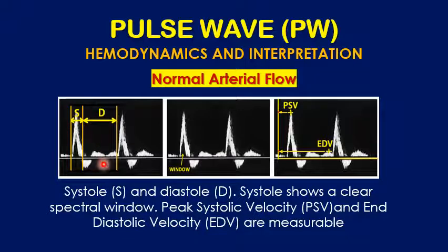This is basic information, so it doesn't add a lot. And this one here, this is the area below the systolic wave. This is usually called the window. We might have the window also under the diastole, but commonly when you want to discuss the window, look at the systolic wave or the systolic component of the wave.